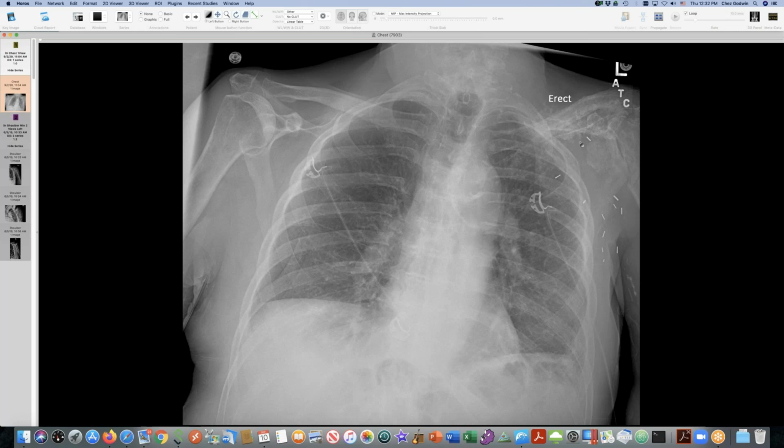And it seems to be all the bones in this region, extending from anterior bones like the clavicle. The distal part of the clavicle is very thickened and irregular here. The proximal part looks pretty much normal, but distally it gets bad.